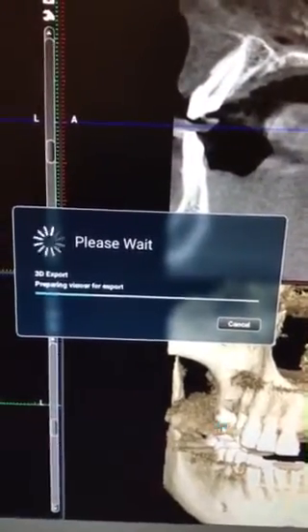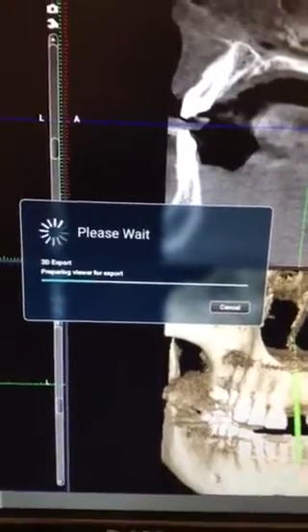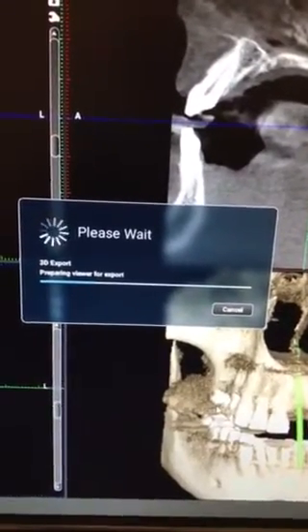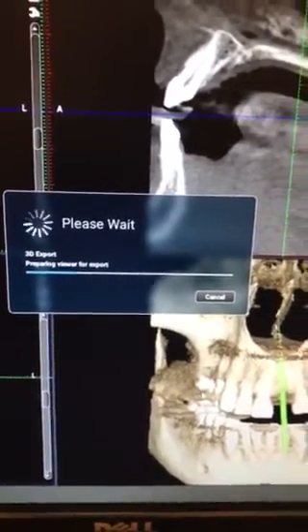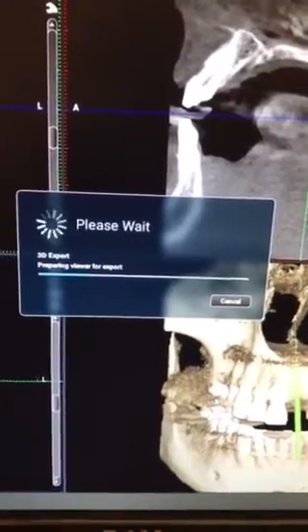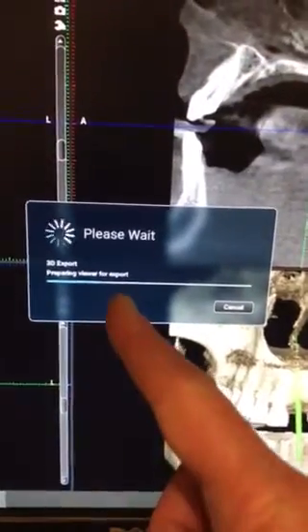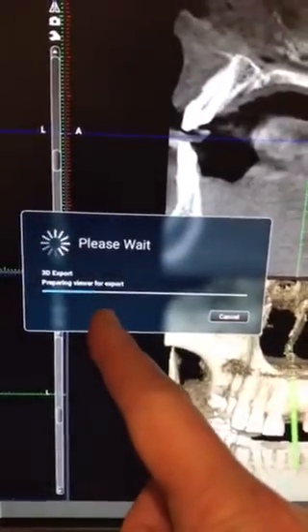Some things will happen. Prepare for export. Once it says it's burning the CD, you're good to go. It'll take about 5 minutes, and then the computer will pop it out when it's done. But don't walk away from the computer until you're sure it's burning, because it might get an error or something and you might have to start over. Anyway, I'll stop here. These words will change, just saying the CD is now burning, and then you know you're good to go. Okay? Then you just label it and put it in the mail.